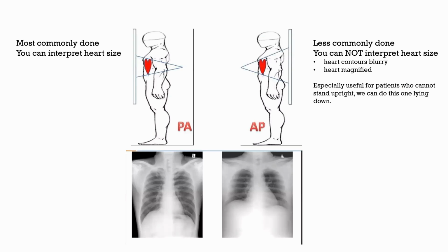Right, projection is the really important one I want you all to remember. It depends where I keep saying the camera, but there's a little device that sends the X-ray, right? And then there's a screen, which is where the X-ray will print onto the screen, okay? So if the little X-rays are sent through the back and they are printed on the front, as you can see the screen here on the front, this is called PA, posterior anterior. The little X-rays come posteriorly and they will land on the film, okay?